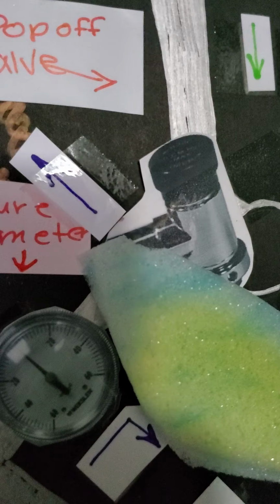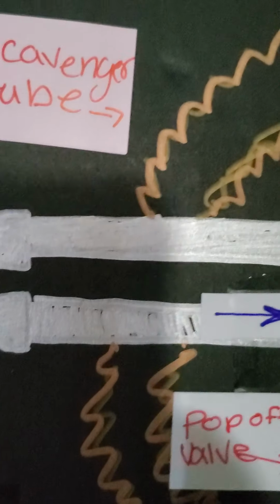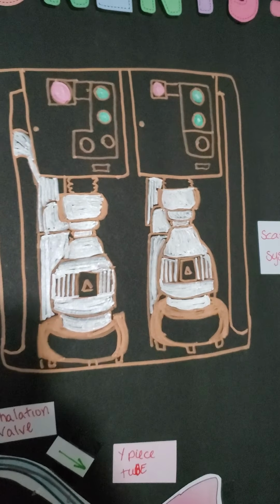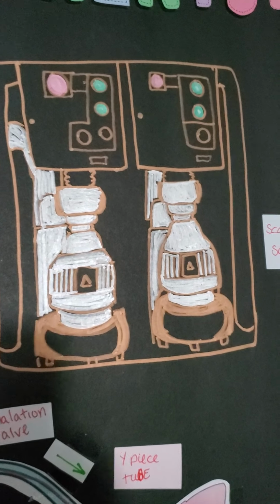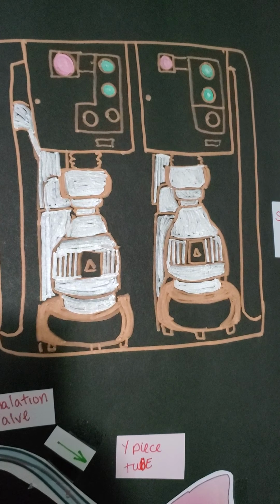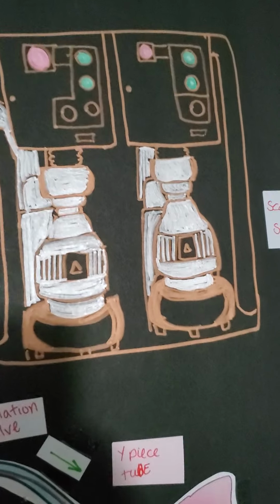And it's going to go to either the CO2 absorber or it's going to head towards the pop-off valve where it's connected to a scavenger tube, which will lead to the scavenger. If it goes through the scavenger tube to the scavenger, it's going to filter out those anesthetized gases. That way we do not breathe in those waste gases.